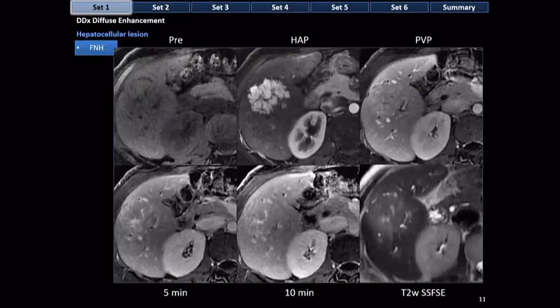of focal nodular hyperplasia. So notice here that we have a mass that diffusely hyperenhances in the arterial phase, and notice that the enhancement is homogeneous except for the central scar and the radiating network of fibrous septa that do not enhance in the arterial phase. So this focal nodular hyperplasia is actually composed of multiple subnodules separated by fibrous bands and scars, but each one of the subnodules enhances to the same extent.